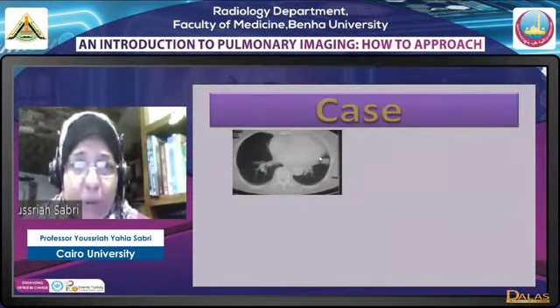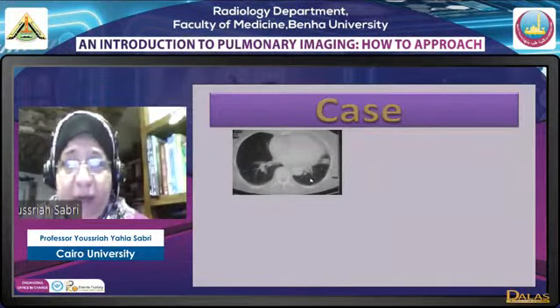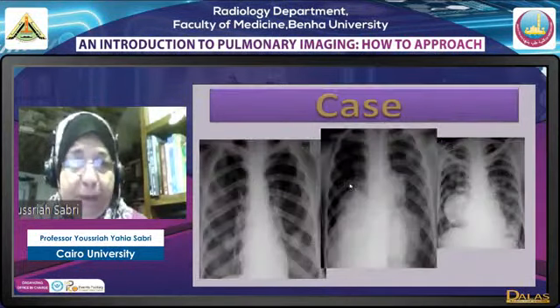Again, a case showing a nodule in the lower part of the left lung. Tissue characterization, mediastinal image show fluid density, multiplanar imaging show that actually this is the site of the fissure and this is only fluid in the coronal image. Again, tissue characterization, multiplanar images.